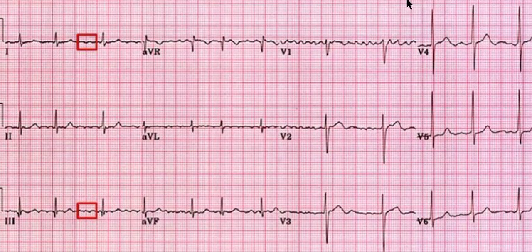So first, in this ECG, look at the calibration. The calibration is normal, 10 small squares in height, and the plateau is horizontal. So the electrical voltage is calibrated normally, and if this calibration is not given to you, you may not comment on this ECG. So the calibration is normal.